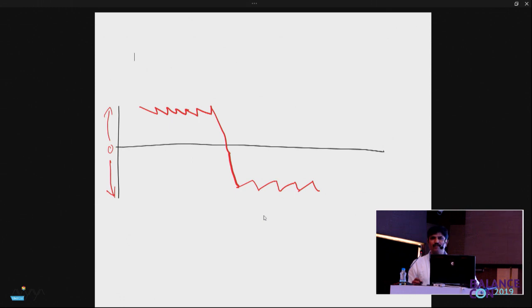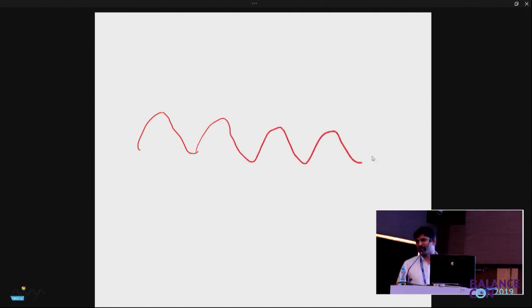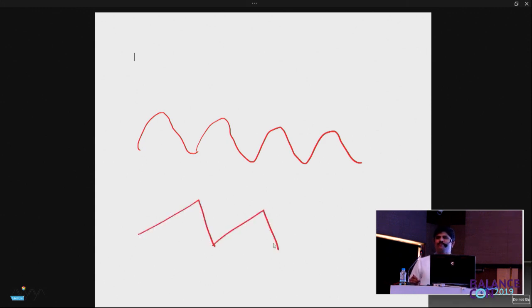Fine. So now we saw the nystagmus. This is the typical jerk nystagmus. What does jerk nystagmus have? There is a slow and a fast component. If there are two slow phases, then it is considered a pendular nystagmus. So pendular nystagmus has two slow phases. Jerk nystagmus has one fast, one slow, one fast, one slow, and one fast phase. So these are the two things that we know.